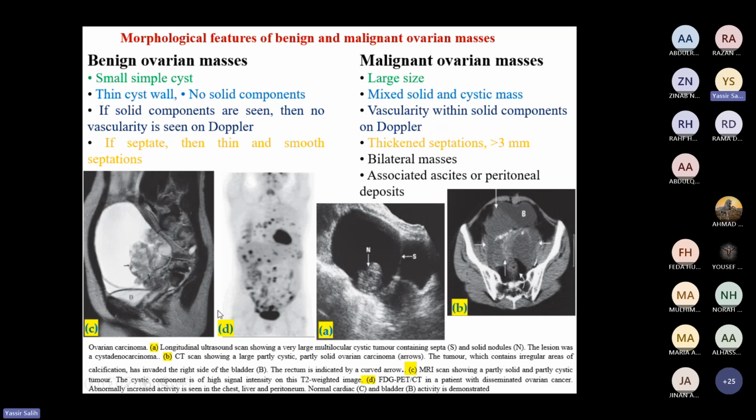As you said, it is difficult from one section to know that this is the ovarian tumor. We give you one image, but at the station with CT you can follow the lesion, know its boundaries and which side it extends towards. But really, from this one image it is difficult to say that this is an ovarian tumor.